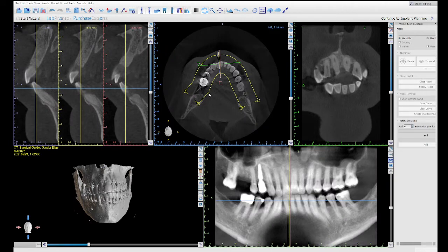Okay, at this point, this window that opens up is for if you have an STL file, like the maxilla. We have the maxilla in this case, so I'm going to go ahead and import the STL model of the maxilla. I can click here, then it's going to ask me where to locate that file, and it's taking a little bit longer, so that is going to read.